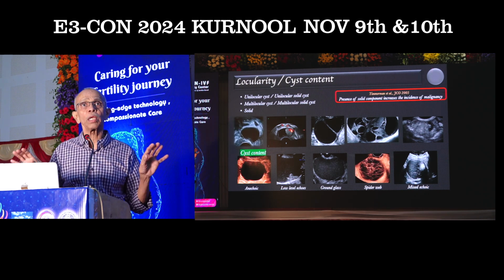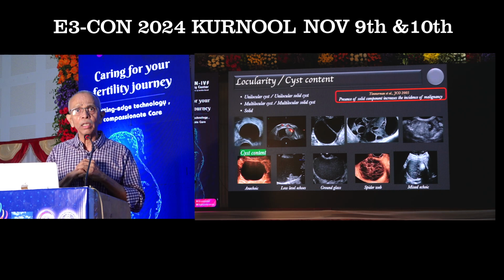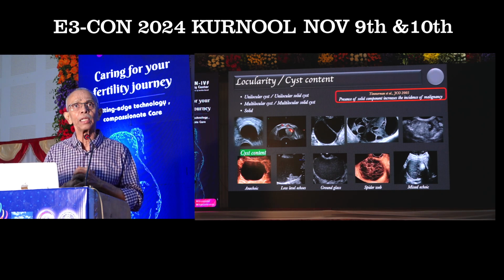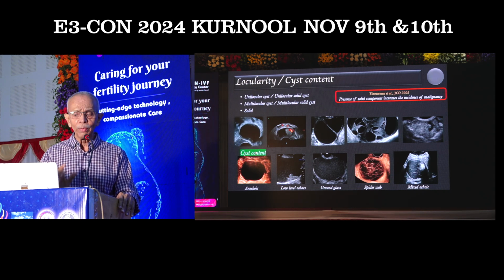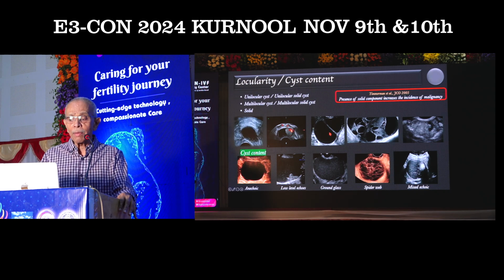You should not use "complex adnexal mass." That's not the way you are going to describe an adnexal lesion. There are specific terms that have been intended, and this is how you are going to evaluate these lesions. So next is the multilocular one.